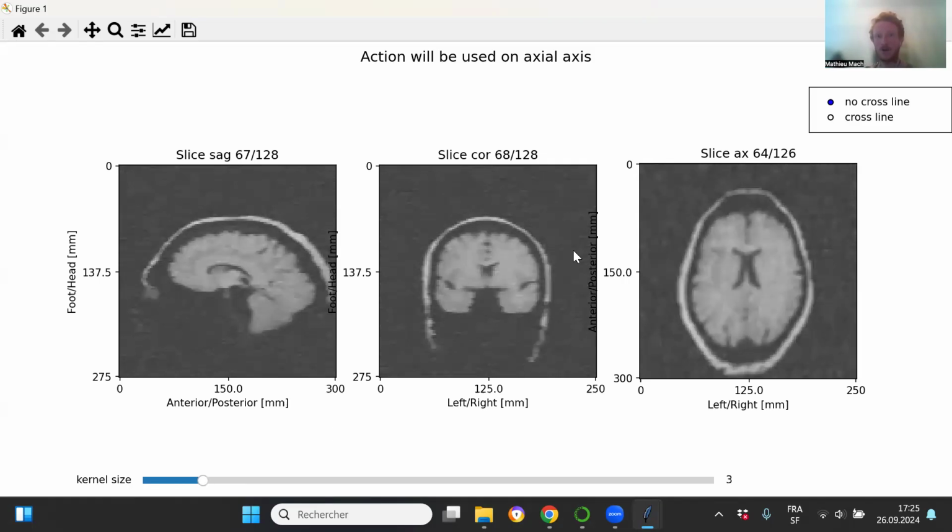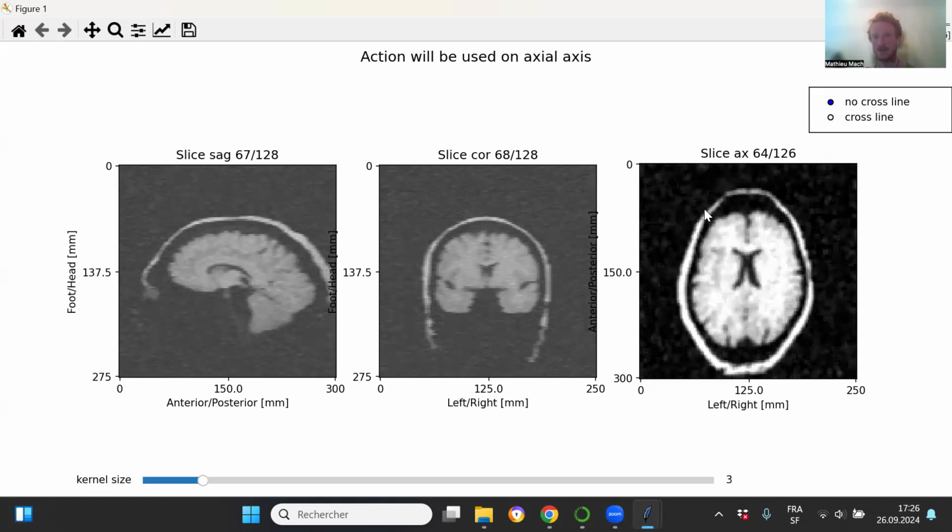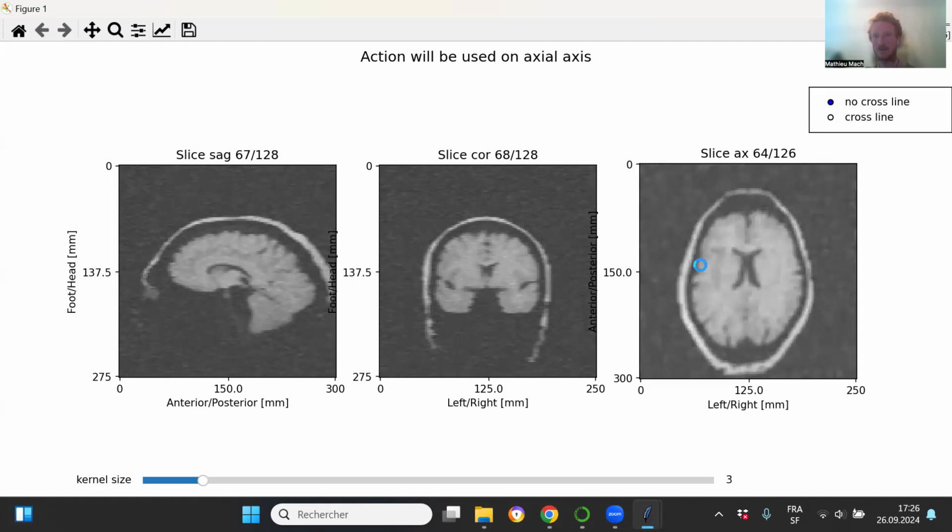Also, every time we have an interactive window, if you just take your mouse and left click, and then move up or down, you will change the intensity and the brightness of the image. So this is a nice interactive feature to understand what a 3D data set is.